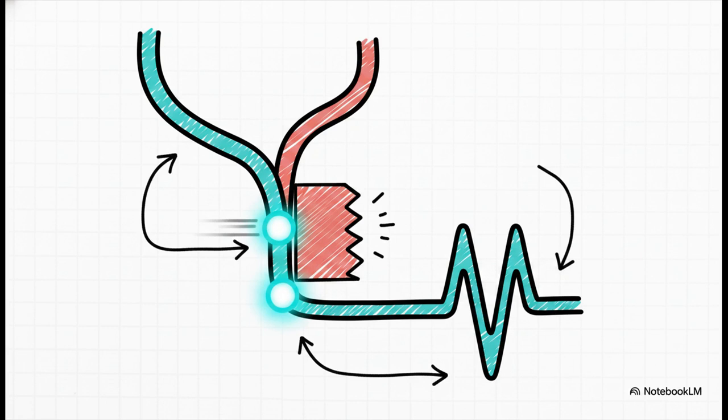And let me just emphasize a critical point here. When you see that wide, aberrantly conducted beat, your first instinct might be to call it a PVC, a ventricular premature beat. But it's not. The origin of the impulse is still supraventricular. It's atrial.